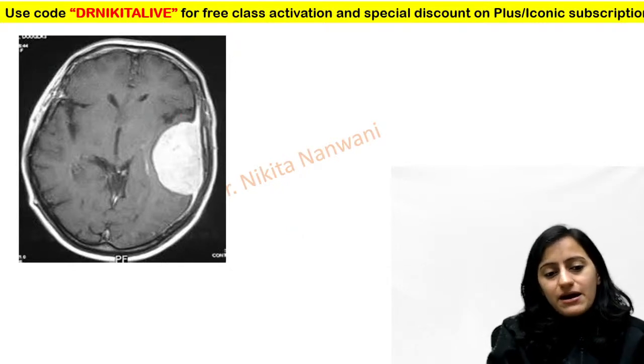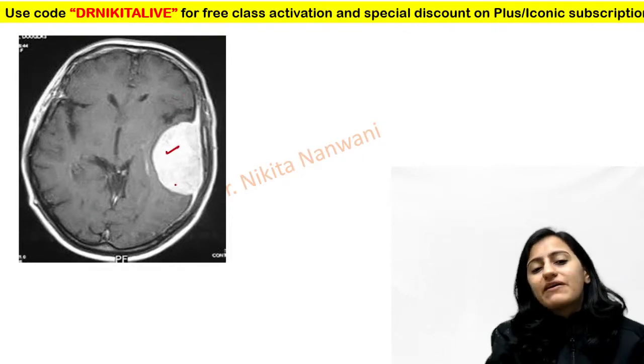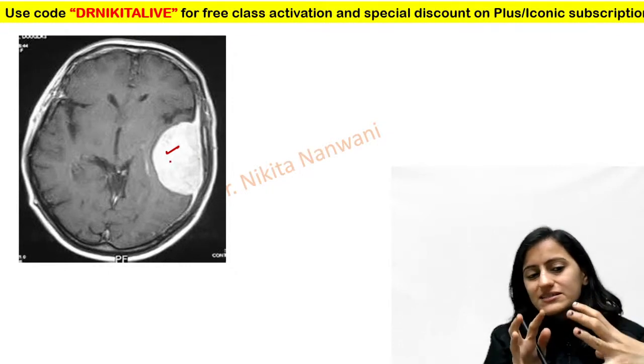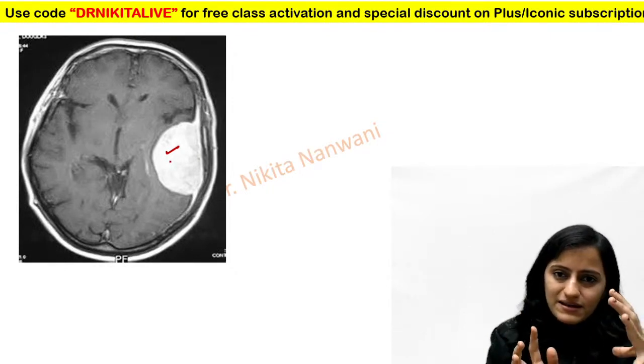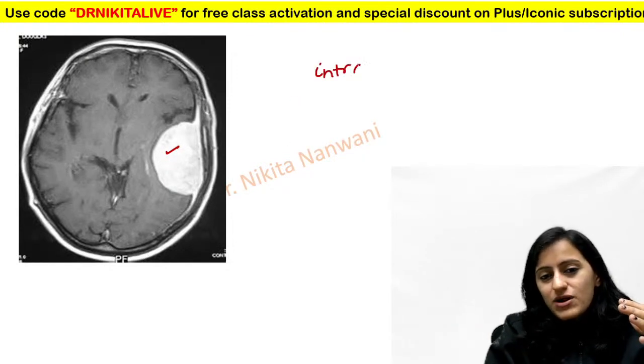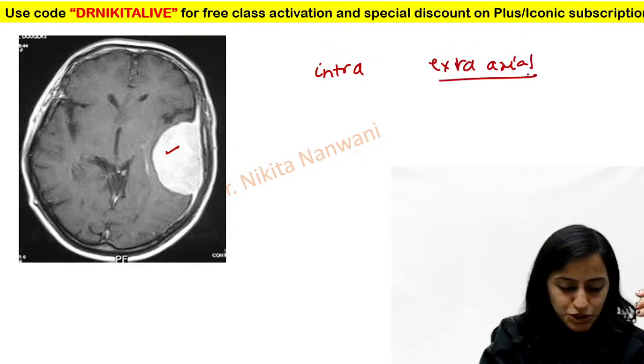So this is an MRI, a contrast enhanced MRI. We see a very well defined lesion here. Tell me, what do you think? Is this tumor, this mass, within the brain parenchyma or is it outside the brain parenchyma? Is it intraaxial or is it extraaxial? What do you think this tumor is?